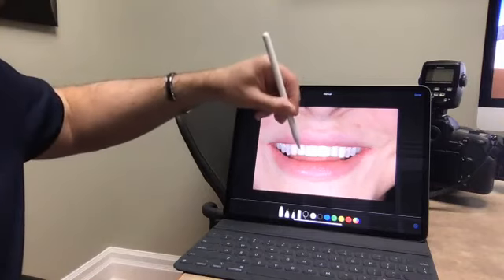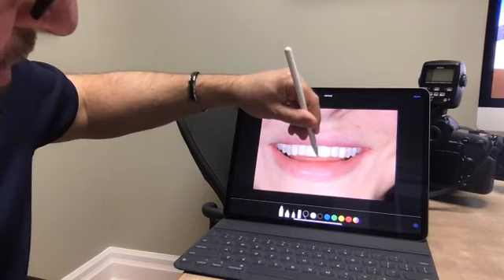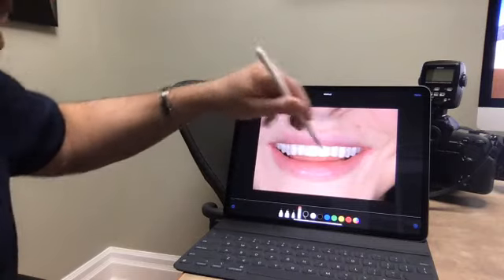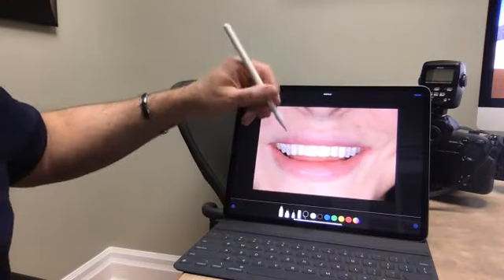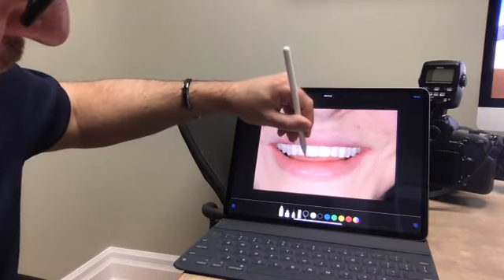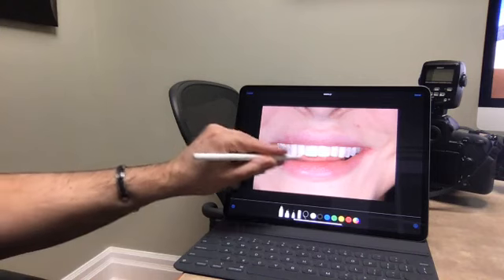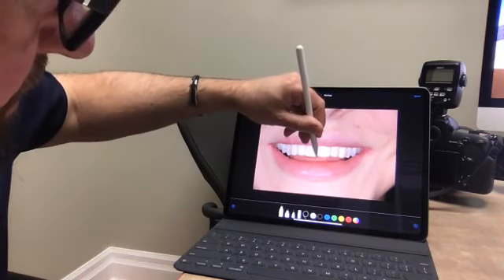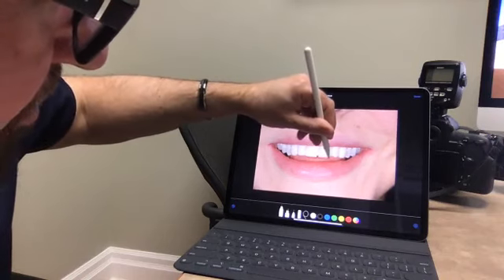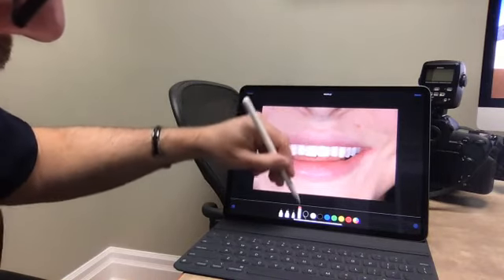I would like black, and I would like to increase the incisal edge position. So you can see here, we're going to lengthen these teeth. I don't like that. I'm going to erase it. It's hard to draw upright. I'd usually put it flat to draw, but for this demonstration purpose, I'm going to leave it upright. So I'd like to lengthen those teeth, probably about that much to be more in line with the bicuspids. So maybe about that much and about this much here. I don't really like that distal corner, so I'm going to redo it.